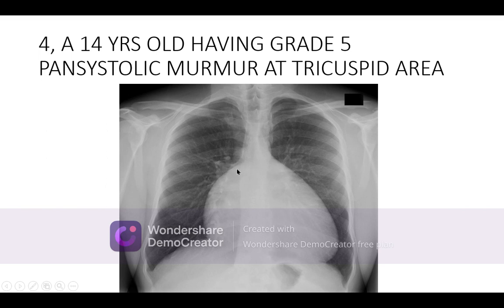It is not pericardial effusion. So what is this then? This is the left border of the heart, this is the right border of the heart. And the cardiothoracic ratio is increased, and the apex is going transversely. It's a boot-shaped heart. In Latin it is called cor en sabot.